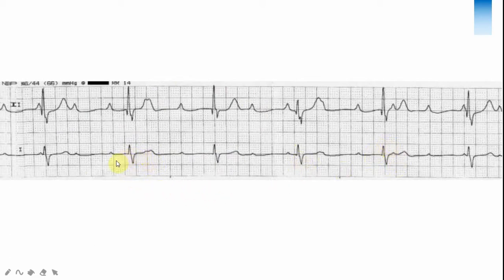My immediate action would be to obtain a 12-lead ECG. Obviously, as a clinician, my role would be to seek and treat the underlying cause. For example, the third-degree heart block can be due to drugs like beta blockers or myocardial infarction. The cause needs to be identified and appropriate action needs to be taken immediately. This is a bread and butter ECG for any emergency medicine doctor.